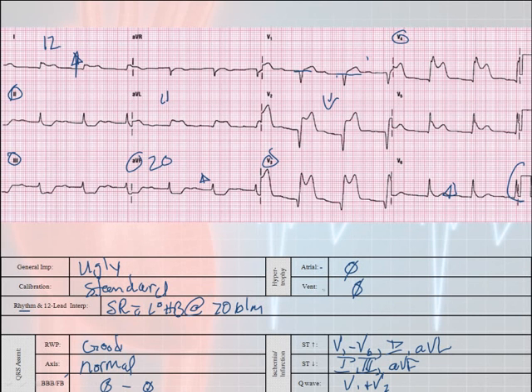Now that I have all this information, how do I actually interpret this? Fortunately, we don't have any hypertrophies or R-wave issues, axis deviations, or bundle branch blocks, so my overall interpretation for my rhythm and my 12-lead interpretation is going to be sinus rhythm with a first-degree heart block at 70 beats a minute with, what does this tell me right here, this elevation? Anteroseptal lateral wall MI.